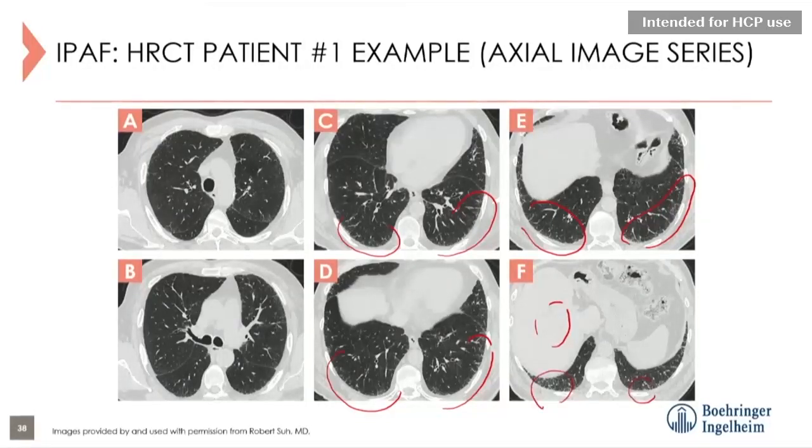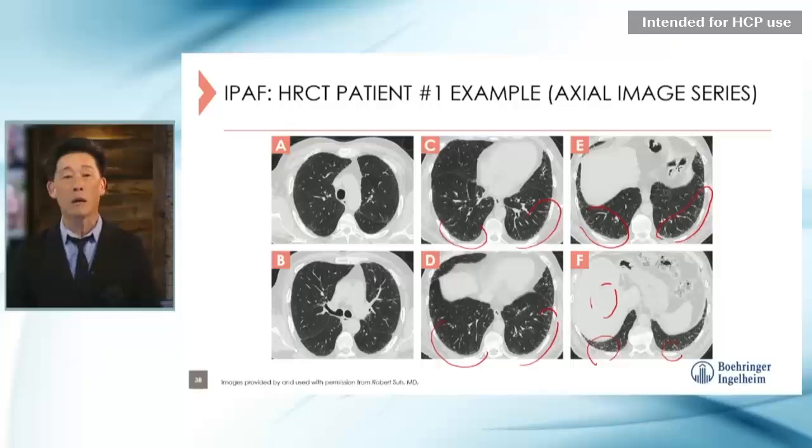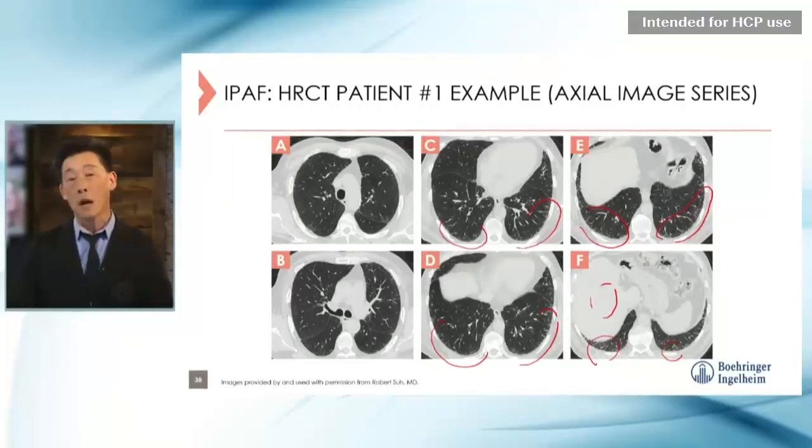And again, you should start thinking that this may be a fibrotic lung process, although less involved than some of the other cases we've showed you, especially Juan's cases. And we also see that there is really no honeycombing. So we also notice the distribution. It's down in the lower lung and out in the periphery. So when somebody looks at this, depending on their confidence level, and again, this is not 100%, and everybody interprets this with a little degree of confidence.